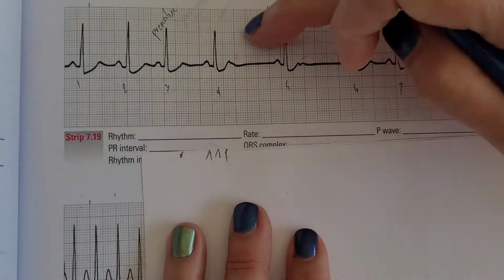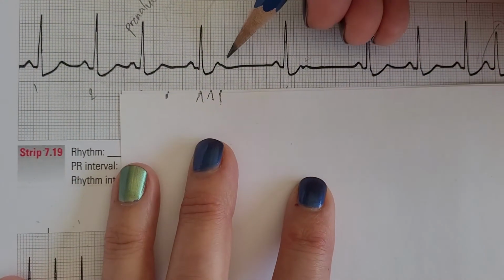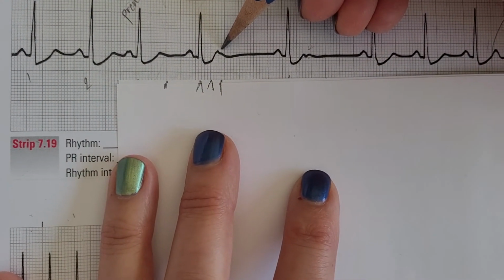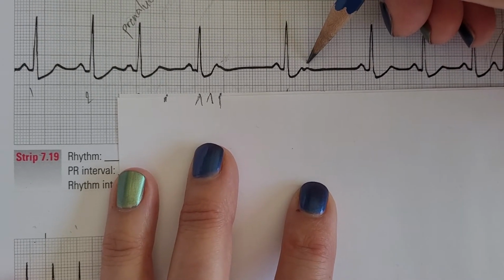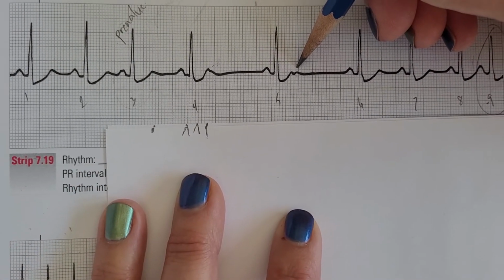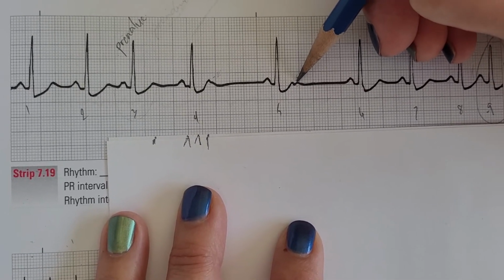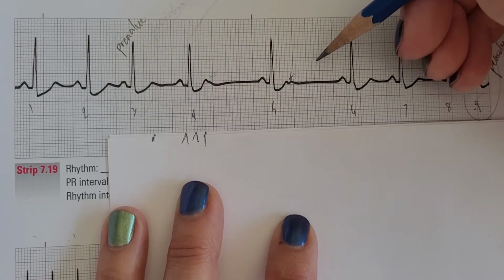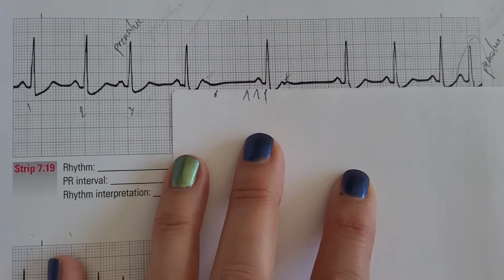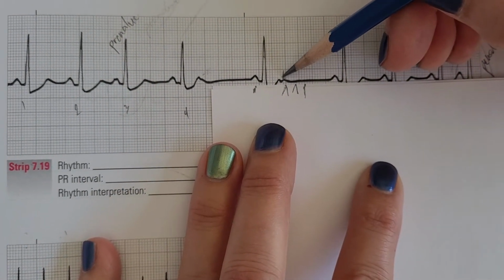Okay, so what's going on in the two gaps over here? If you can look here, I'm going to draw your attention to the TP wave. You may not recognize it at first, but it is more pronounced in the second or the fifth complex here. So this is the T wave beginning, and it's notched because there's a P wave here. You see the P wave occurs, but there's no complex. So it's early because the P wave comes in early.